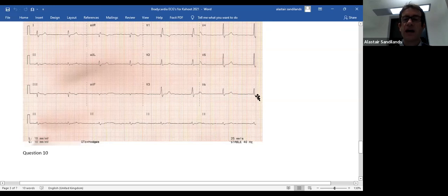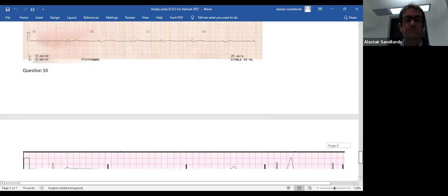If you had flat everywhere, then you'd think about a junctional rhythm. But because this is AF, normally it conducts through, and you'd have an irregular rhythm with AF conducting through the AV node. The presence of AF with a regular rhythm means that there is a complete heart block at the AV node. So you're seeing AF in the top chamber, and this is the escape rhythm just below the AV node, as there is complete heart block. AF with complete heart block.